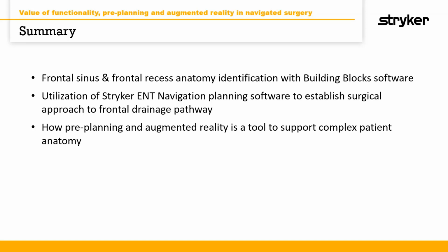So in summary, what we've just demonstrated is the use of building block software to aid us in identifying the anatomy of the frontal recess and all of the cells that occupy the frontal drainage pathway. This software is critical so that we can all discuss anatomy and patient cases using the same nomenclature and the same names for each of the various cells. And I really think that this type of software has been essential for improving our understanding of the three-dimensional anatomy of the frontal outflow tract.